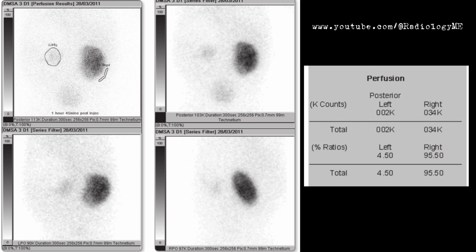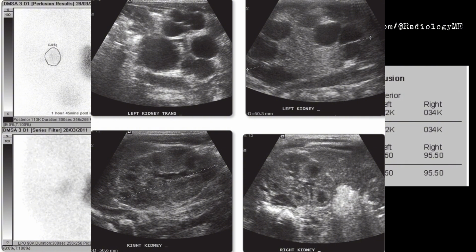the anatomical detail. Speaking of ultrasound, we also have some selected renal ultrasound images to review. When I examine the left kidney, I see that it's grossly abnormal. It's larger than expected for this age group, measuring about 6 centimeters, and I can clearly see multiple large cysts, mostly located cortically. There's minimal normal renal cortex left, which is highly suggestive of multicystic dysplastic kidney.